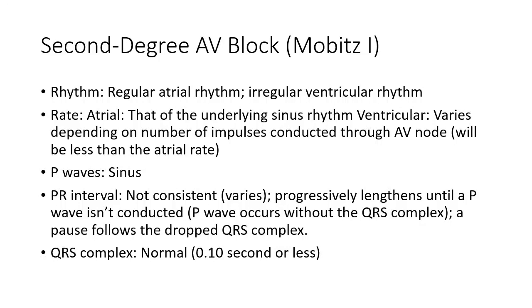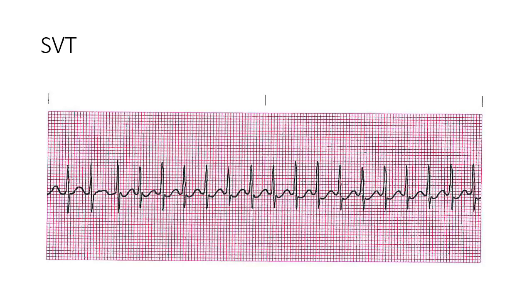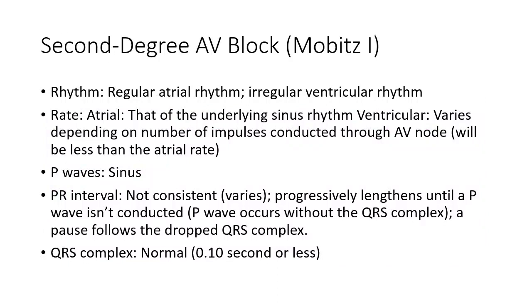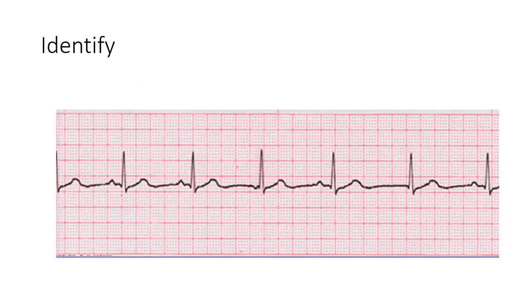And so again, not only do I want you to look at rhythm strips like that, I also want you to know the rules, because this is how you're going to identify this. Very good recovery. All right, Teray, this one's yours.